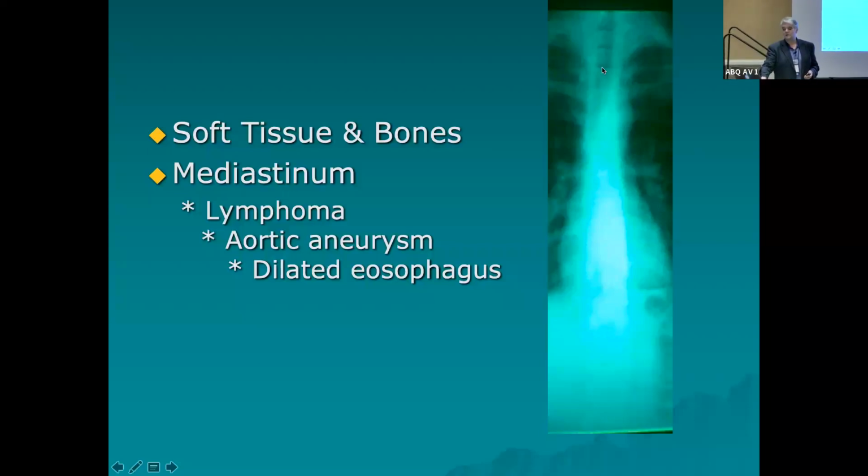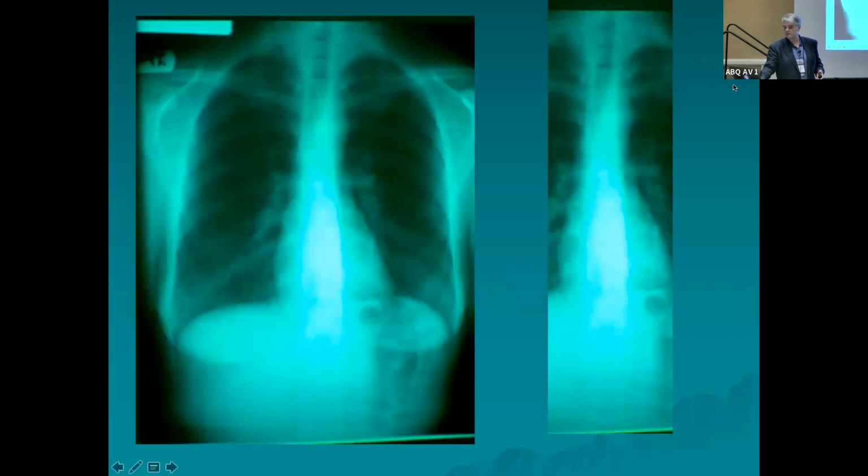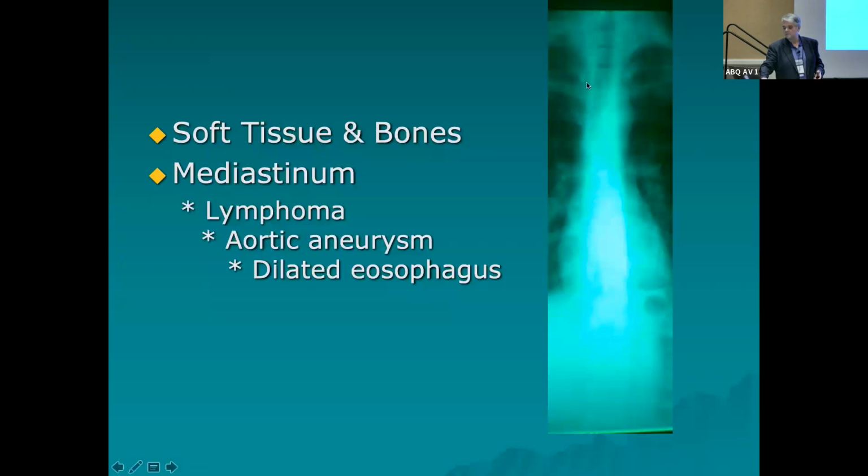The trachea comes right in through here, but it actually bifurcates right underneath our clavicles right here. So if you feel your clavicles right here, you can feel that angle of Louis that's right there. The bifurcation is actually right here under that angle of Louis where it bifurcates into the right and left main stem bronchi. Whoops, back up there. Right in through here is where it bifurcates into right and left.